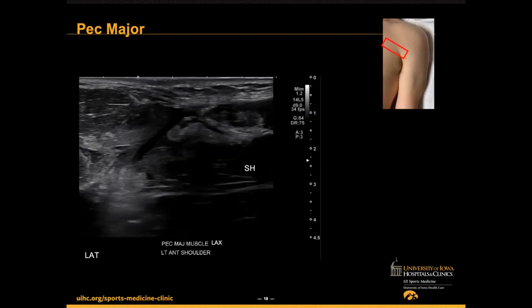We did perform dynamic imaging that I unfortunately could not pull off of Epic and into this presentation, but there was retained movement with dynamic imaging. There was retained contraction. It was a little bit dyskinetic in this area as expected, but there was retained contraction with dynamic imaging.